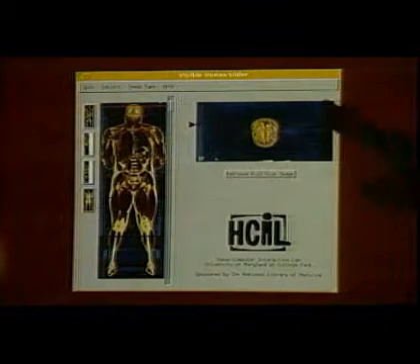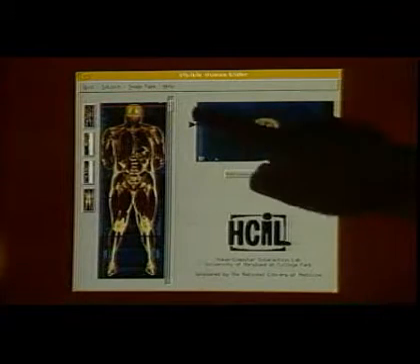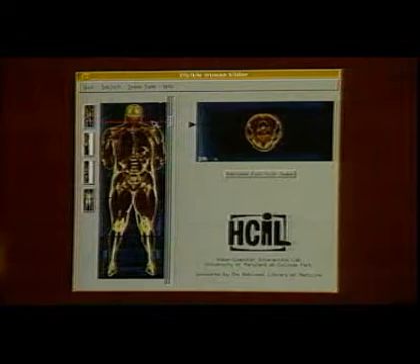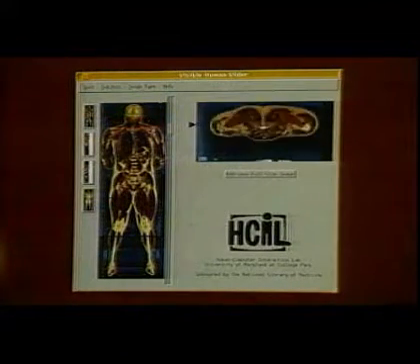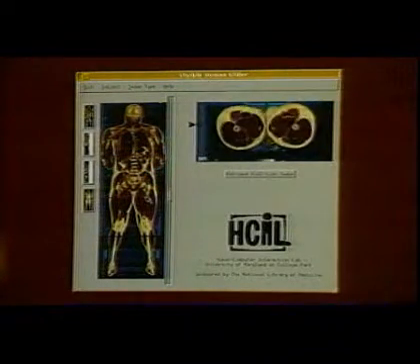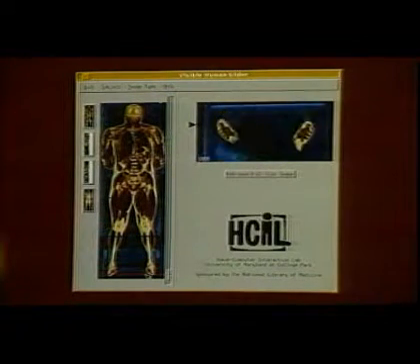This is a local view, showing a thumbnail of the axial section corresponding to the slider position on the overview. We can explore the dataset by simply dragging the slider. The local view updates in real time, giving the experience of motion through the human body. Here we see the brain, the shoulders, the torso, the abdomen, the thighs, the knees, and all the way down to the toes.